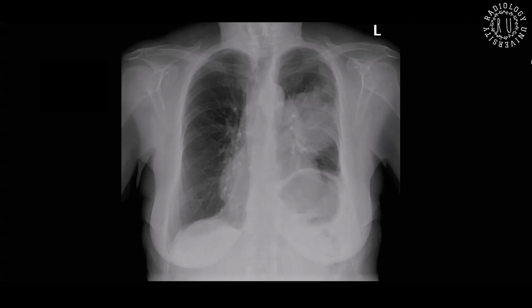In my usual practice, I would like to see if this patient has a lateral chest X-ray for better delineation of the location of this mass lesion, and I would like to inform the referring team and refer these patients for a contrast CT thorax for further delineation of the mass lesion. Otherwise, in the rest of the chest X-ray, apart from the mild left pleural effusion, there's no right pleural effusion or pneumothorax. So, would you like to summarize your findings?